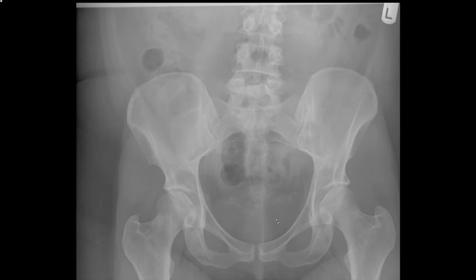The other abnormality when considering trauma to the pelvis is disruption of the sacroiliac joint. Fracturing a bony ring usually fractures in two places. There may be a true bony fracture or there may be disruption of a joint. Just try as an exercise to fracture a polo mint. Try fracturing it in one place. It's virtually impossible. It nearly always fractures in two places.